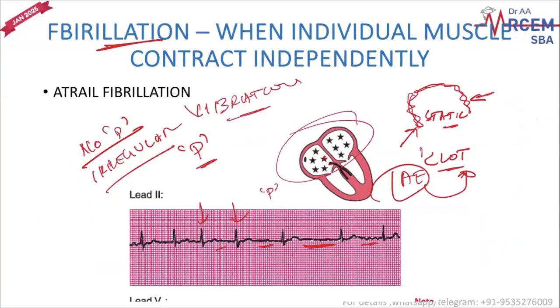That's why atrial fibrillation is important. What you need to remember is that heart rate doesn't matter. Heart rate might be well within the normal range itself. It might be 70, it might be 80. Sometimes the heart rate might be very high. How to manage it, we will be learning in the cardiology chapter. So we'll be getting back here. We're just learning the ECGs.